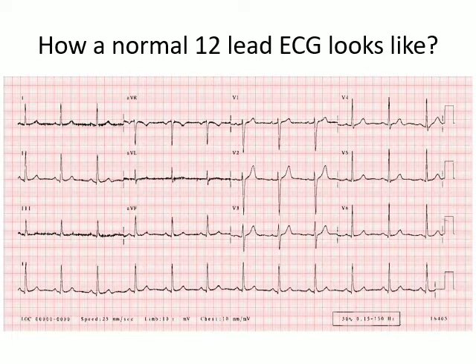So how do I go about it? First of all, I would like to tell you guys about what we see in this ECG. This is a P wave, this is a Q wave, this is an R wave. S wave is not quite seen in this ECG, but if seen, it would be something like this. Then this is the T wave, and this is a TP segment, and then again comes a new P wave, Q wave, R wave, S wave is again not seen, and T wave. So this is how a normal ECG looks.